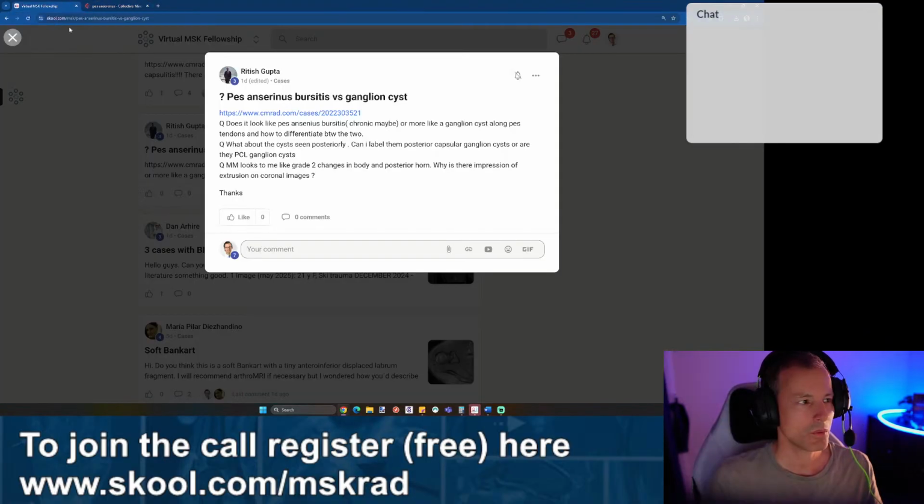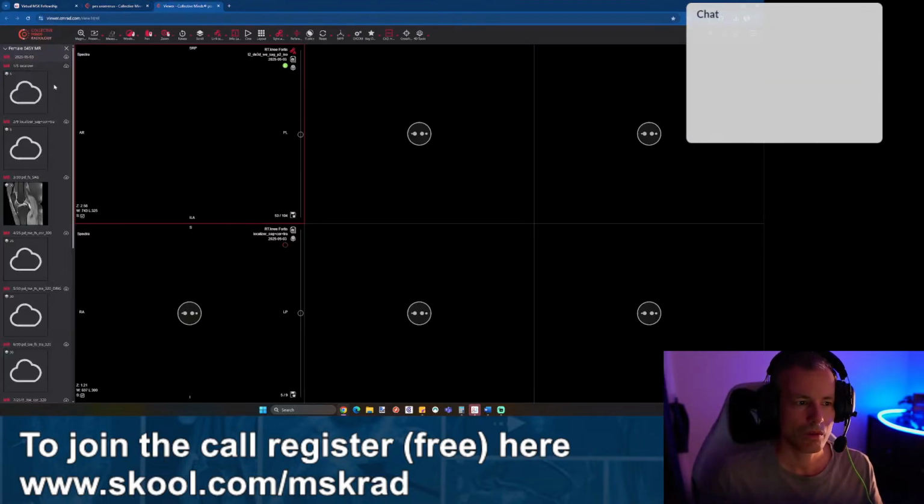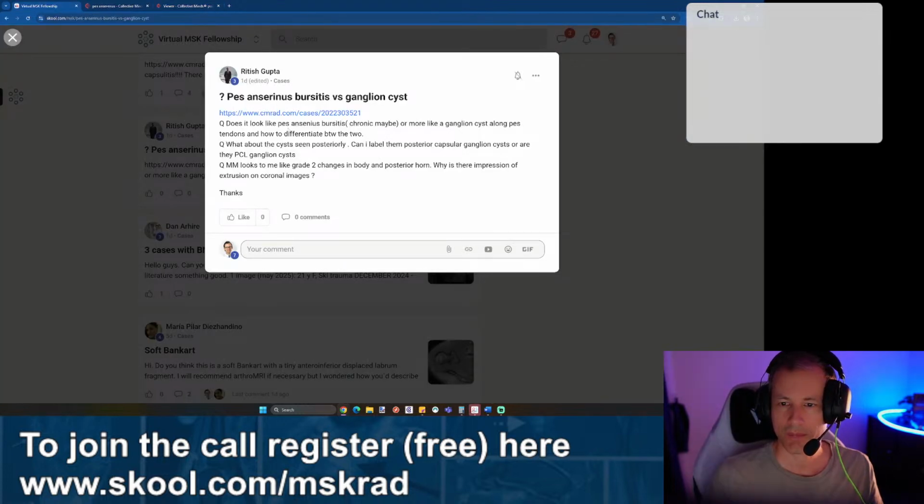Yep, great. So basically, Ritish has a question about pes anserine bursitis versus ganglion cyst. We have the case. Let me just preload the case. The question is, does it look like pes anserine bursitis, maybe chronic, or more like a ganglion cyst along the pes anserine tendons, and how to differentiate? What about the cysts seen posteriorly? Can I label them as posterior capsular ganglion cysts, or are they PCL ganglion cysts? And the medial meniscus looks like a grade 2 change in the body posterior horn. Why is there impression of extrusion on coronal images?